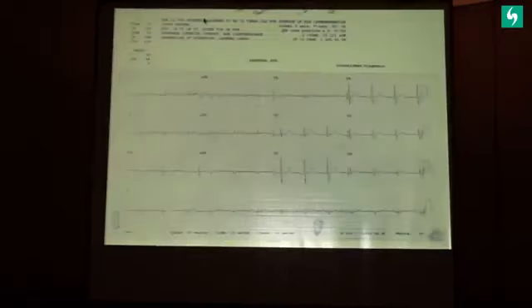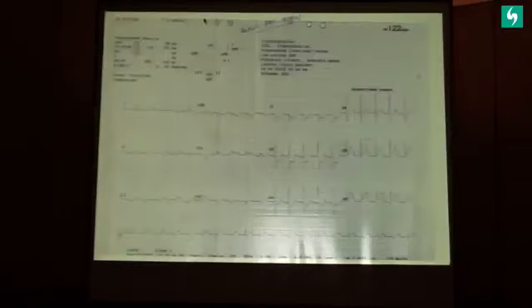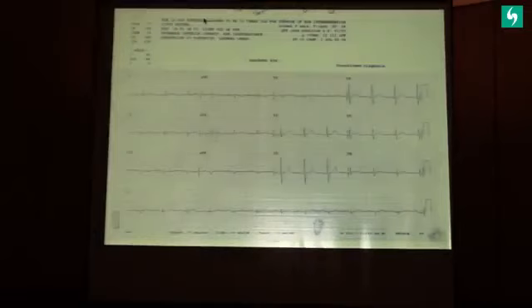See this ECG and see this ECG after angioplasty in the same patient. You see the T wave in V2, V3. They are positive. The ST has gone because it has been promptly revascularized. The ST elevation has gone here. But T wave tells you that this was a current of injury. It is not negative, it's positive.